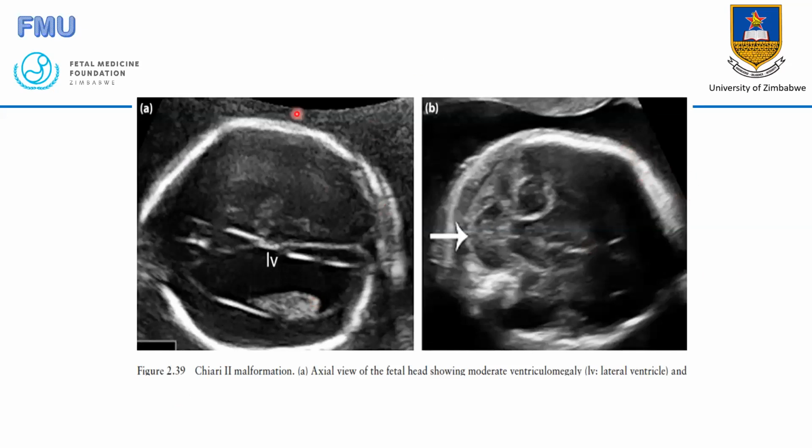When we say a lemon, we are saying this is scalloping. If you check here, there's scalloping of the frontal bones. This scalloping, this tapering towards the front, is what gives us the lemon. The lemon you are talking of is the European lemon, not our lemon, you know, our pimpled lemon. It doesn't look like this. But if you go into supermarkets and look for these European lemons, they are tapered to the front. So this is where the lemon head comes from. If you see scalloping of the frontal bones here, it's called a lemon head if the head of the baby looks like this.